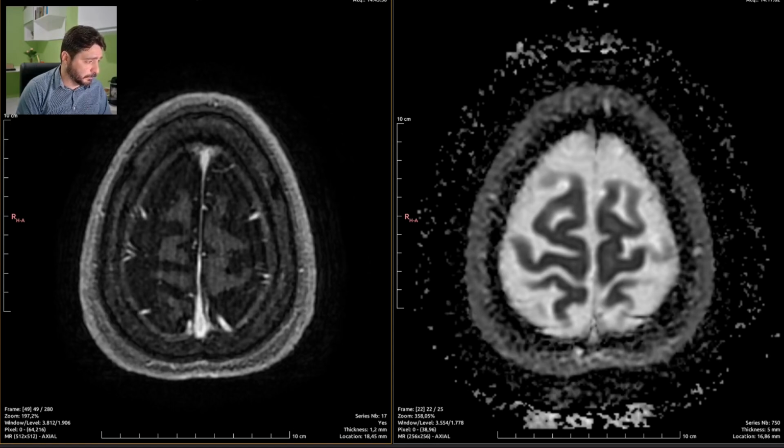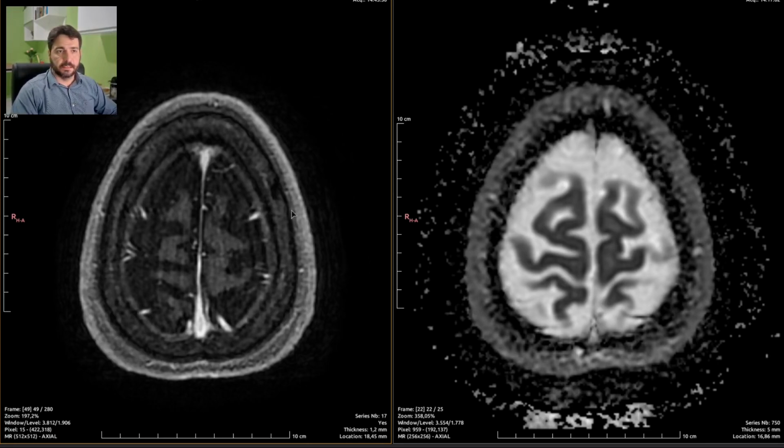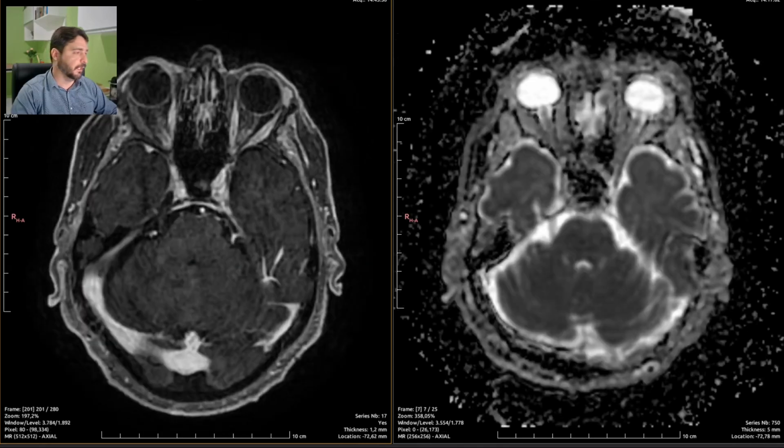And I'm going to summarize the report to make it easy for reading, so the referring physician is happy when he gets this and just reads a few words and knows what the report is all about. So let's get back to this exam. We have to see contrast enhanced phase is fine. We were already reporting it. Now I remember. So hippocampus are fine.